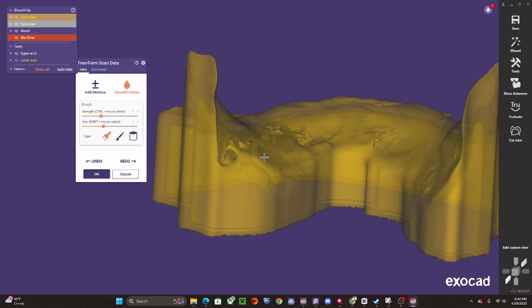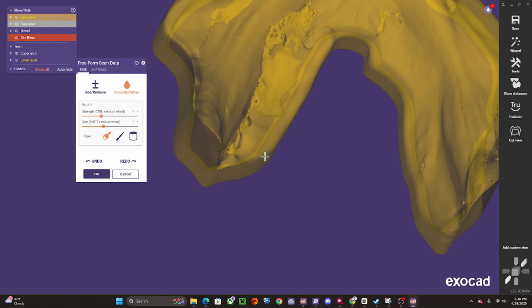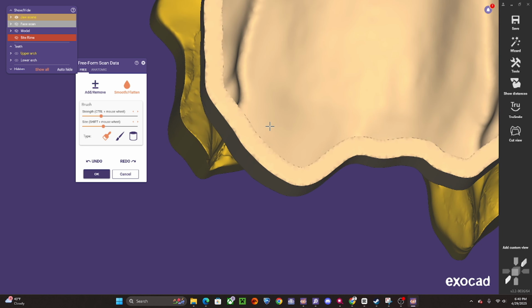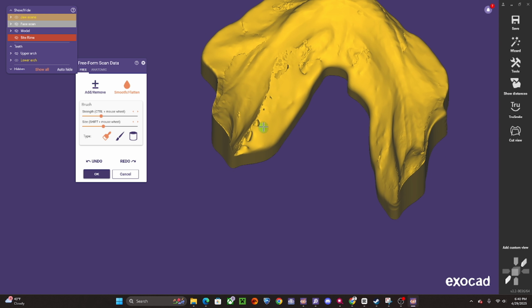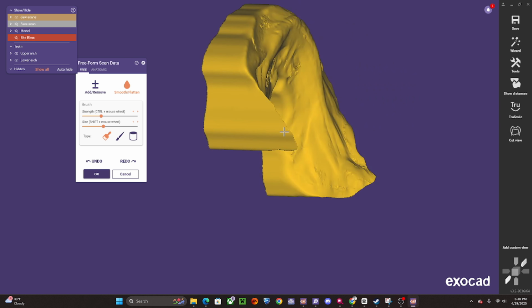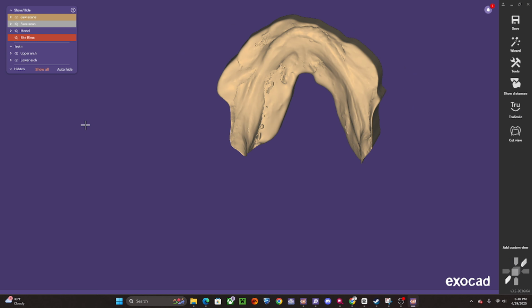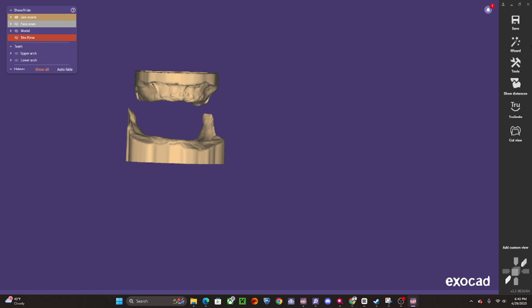But how would I deal with that? I would basically trim the data more. I do see this jaw scan beforehand. It had that double stitching. I'll clean that up. But we 45'd our borders. And now let's jump back into wizard mode.